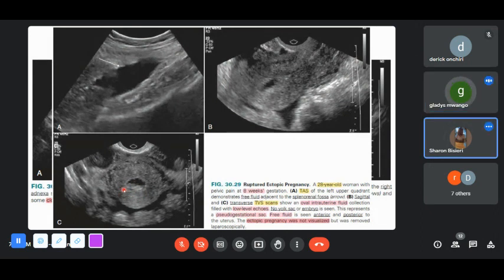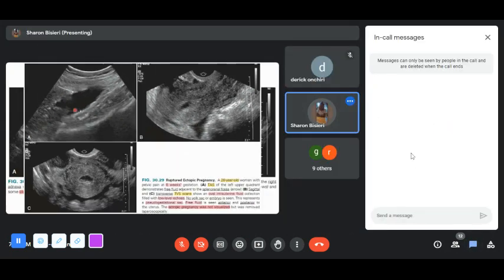So what was there in the adnexa? Unfortunately, in this case they were not able to visualize the ectopic pregnancy. They only got it surgically and removed it. So what image A was showing is a splenorenal fossa with free fluid collection. Just to further emphasize that point, when you examine the pelvis and you see free fluid within it, it's advised that you go superiorly and assess the other potential spaces to check whether you have free fluid collections within those spaces.